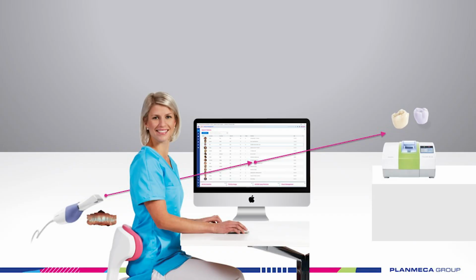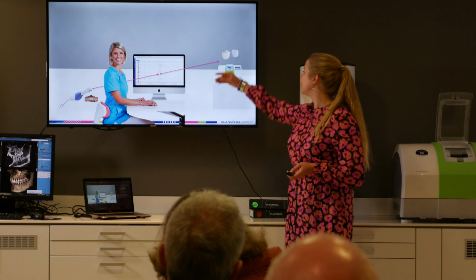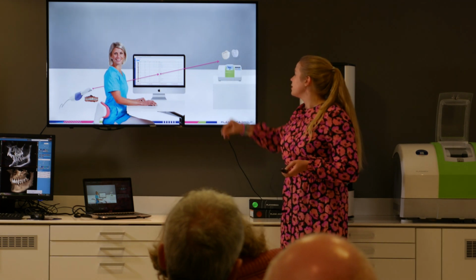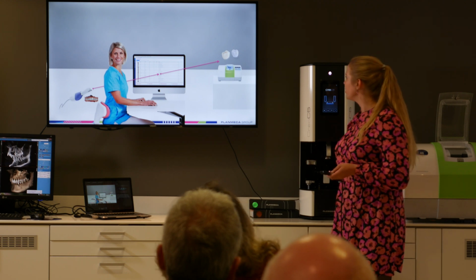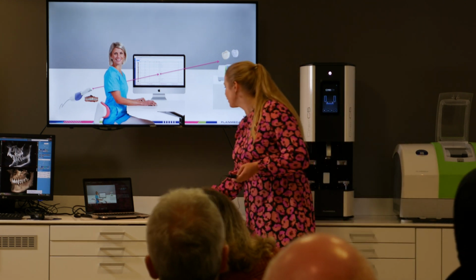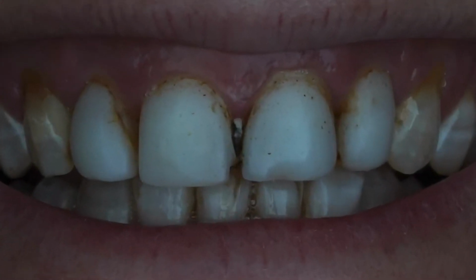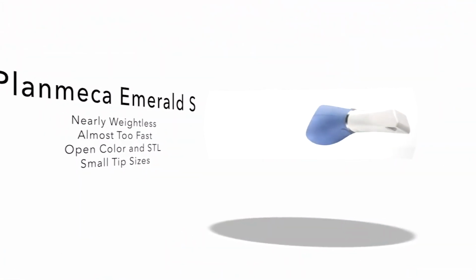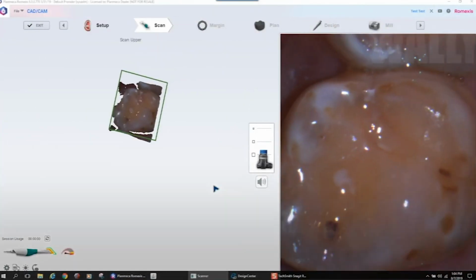Okay, and in the meanwhile, let's continue to this other workflow related to implantology. So if we would be designing and producing the actual restoration, the crown, that would be replacing the missing visible tooth. Here I had to borrow a video from YouTube because my CAD/CAM colleague was too busy to make a video for this occasion. So a little bit of advertising for Emerald S.